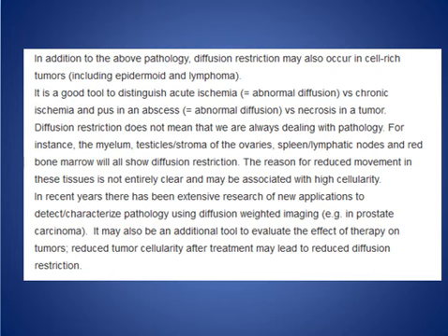As we said, the diffusion weighted images are sensitive for detection of cytotoxic edema, especially in ischemic tissue, either resulting from infarction or traumatic brain injury or other causes.